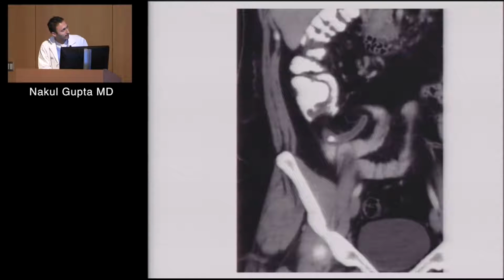The wall is enhancing. I think we use 6 millimeters or so as the upper limit of normal. I don't like to use numbers too much, but this looks inflamed and dilated. And on top of that, the icing on the cake, you have this appendicolith or fecalith, a calcification near the appendiceal orifice, presumably obstructing it and resulting in the appendicitis.